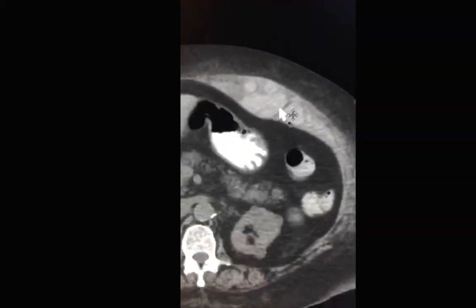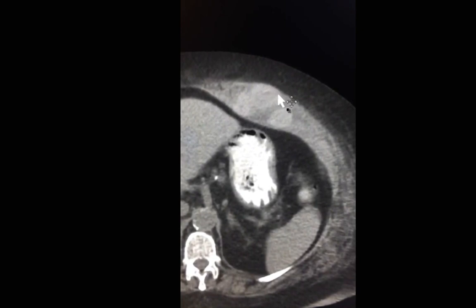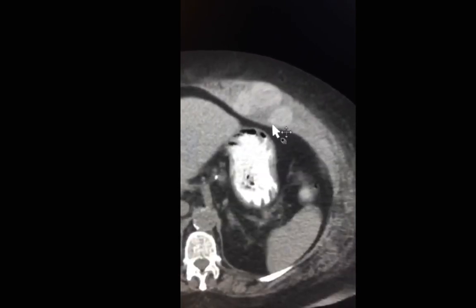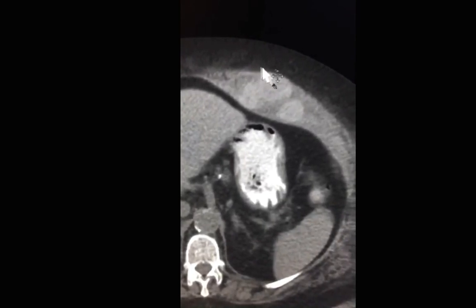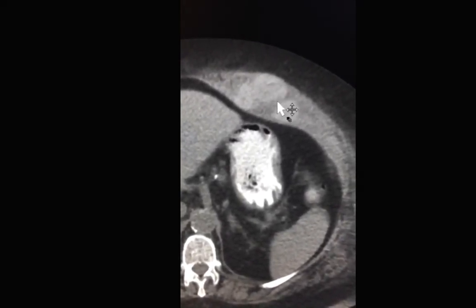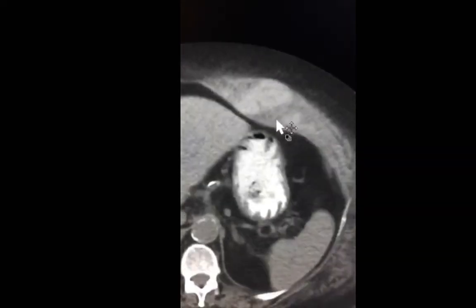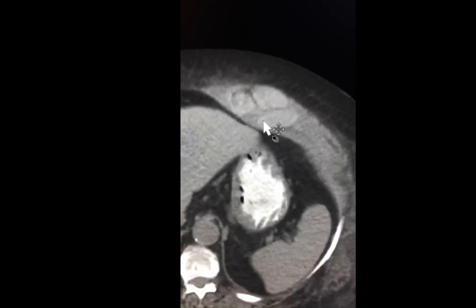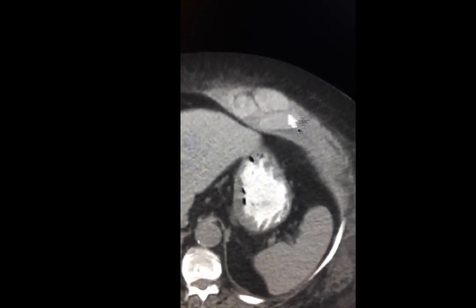So before jumping to the conclusion of this being a primary sarcoma of the muscle or secondary metastasis, think about the described features. The internal expansion of the left rectus muscle with the fluid density and these foci of high density, in addition to the stranding, is suggestive of hematoma. Remember, blood clots on a non-enhanced study may appear bright.